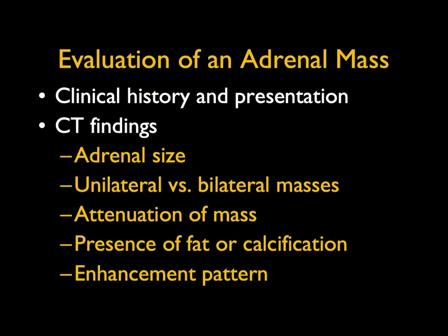Again, smaller lesions are more likely benign, but not necessarily. Larger lesions are more likely malignant, but not always. So again, these various features can be helpful, but are not going to be home runs typically, though enhancement pattern will be a home run, as we'll discuss.